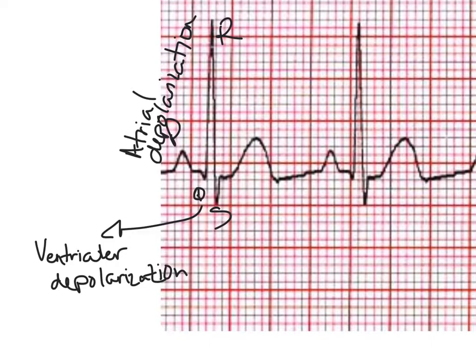All right, now the last wave. Okay, actually not the last wave, we have one more to go, is going to be this guy. This is my T wave. Okay, you see him right here. This is my T wave, and he pretty much closes us out as far as one complete cardiac cycle. And what I mean by that is that instead of a wave that signifies depolarization, the T wave represents ventricular repolarization.